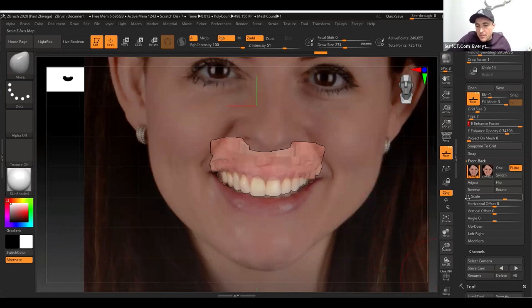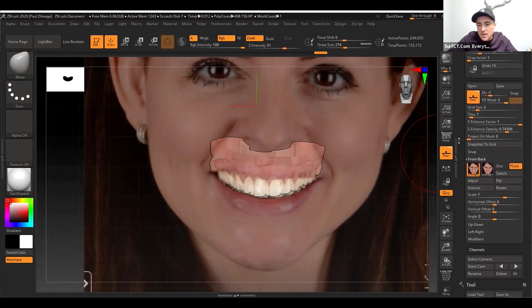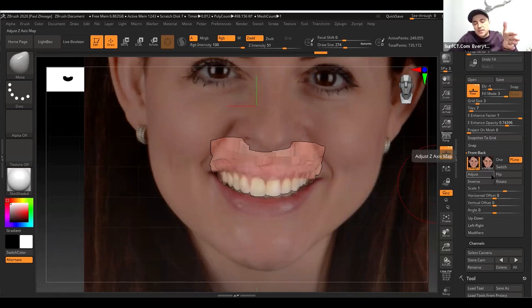So now I'm interested actually to get to the picture that was designed. So the way to do it is you just click the switch button here, and then all of a sudden, my patient has the design. Now, there's like 2 ways of working on this design. So you can see that, like, if I push switch, it's not even that we removed the teeth, but we moved also the midline a little bit.